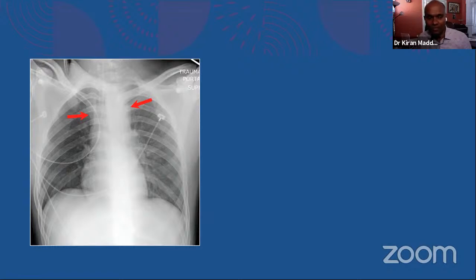How do you examine the patient on your palpation? When you palpate the neck, what are the important things you do? Okay, I think I can reveal the answer for you here. Where is the trachea? You see, is it in the midline? Trachea, I gave a clue there because, yeah, very good.